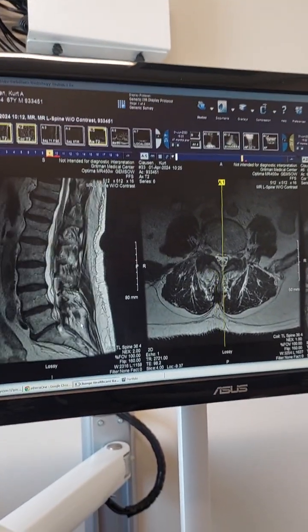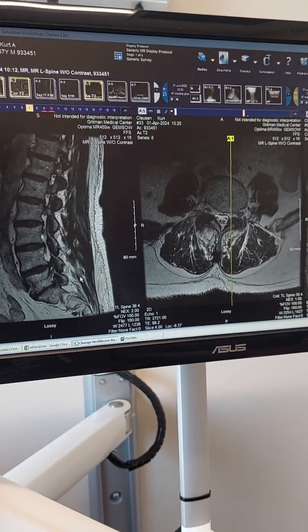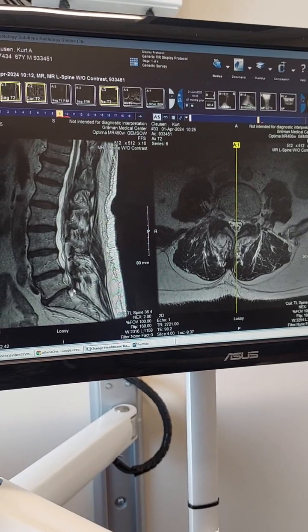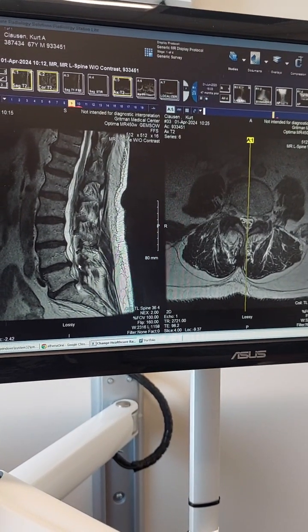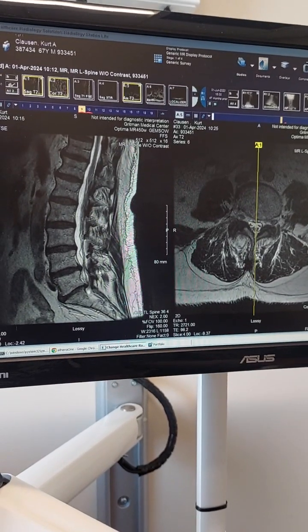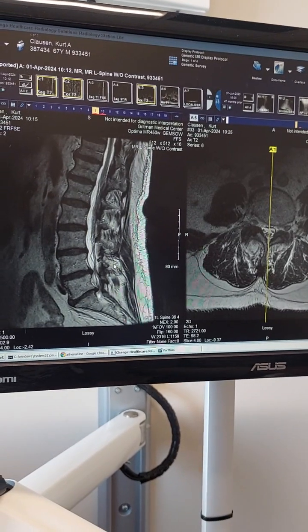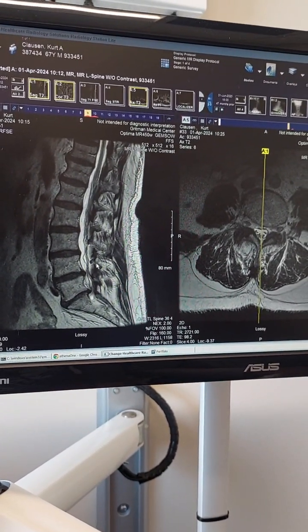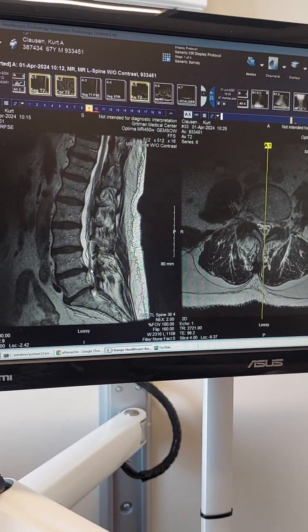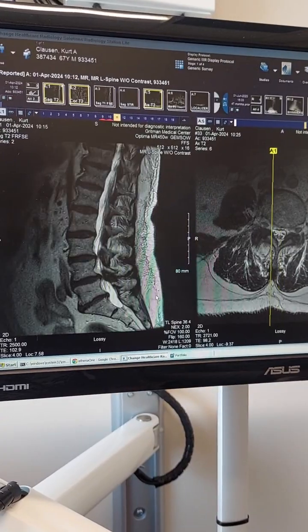Okay. So that would be my recommendation. I would recommend, we've done one here. So everything here that comes through has to get through this point first. I would recommend that we do an injection at this level. That way we're driving steroid here and we've put steroid here, and do it at an overlap to where there's still some of both working to see if it gets you more improvement.